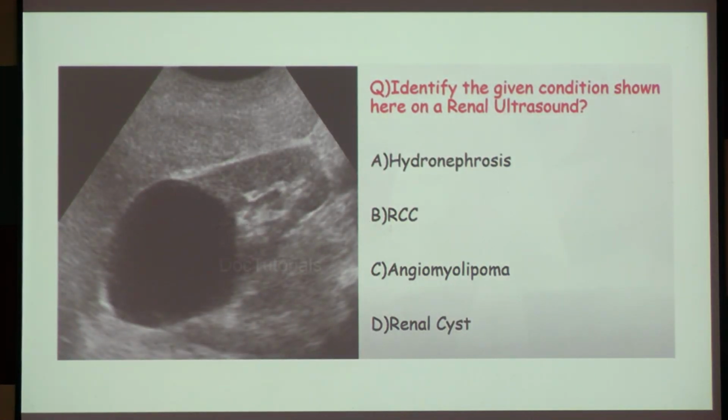Now tell me this. What is this? Can anybody say that? That's fine. Can you tell me any of these four things, which is actually what?